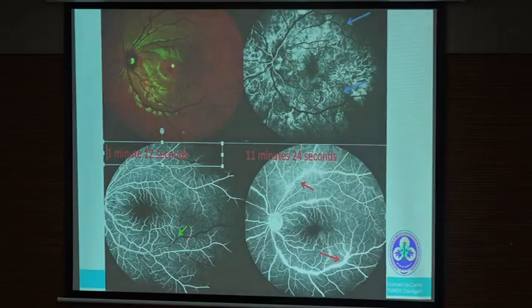This is where you want to see this. So this is one classical example where you see this: the blood is like a bullet. If you are seeing this kind of a look here, that means something is wrong with this blood. It is slow. So again, you can see the timer there. This is again in 1 minute it has not filled the vein. So something is wrong. Whatever the etiology is, your antenna should be up that we have picked something on the fundus fluorescein angiography.